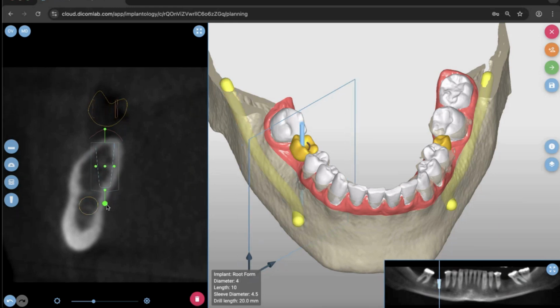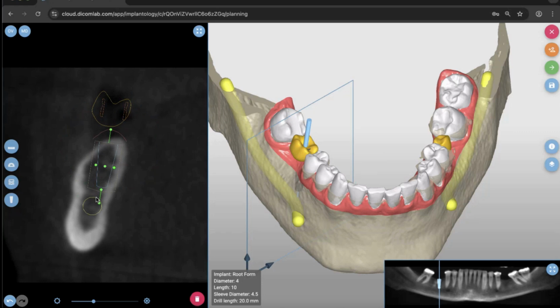With the buttons further away, you can set the angulation of the implant, and the angulation is immediately visualized around that circle. So it makes your life easier to plan, for example, a tilted implant, tilted abutment for a classic all-on-4, all-on-6 case.